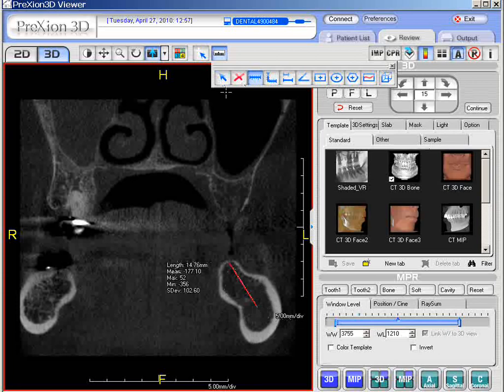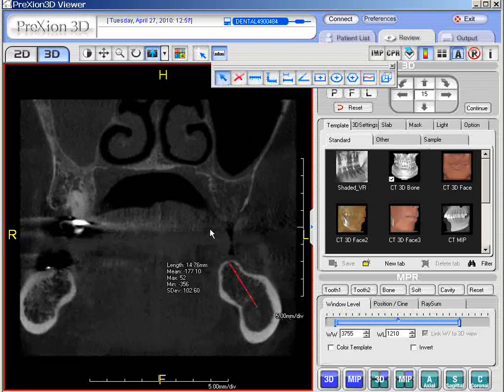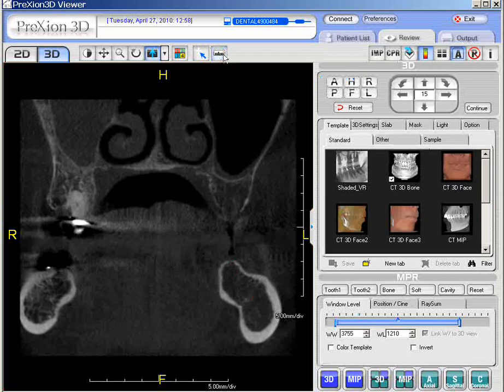What we can do is left click the selection button, and then as we scroll back and forth, it maintains that frame that has the measurement on it. So as long as we keep the toolbar open and have the arrow in the selection position or neutral, we have this ability to freeze what we measured in that particular slice. To quickly get out of measurement tool, click it again, and all of your measurement tools in that toolbox has been removed.